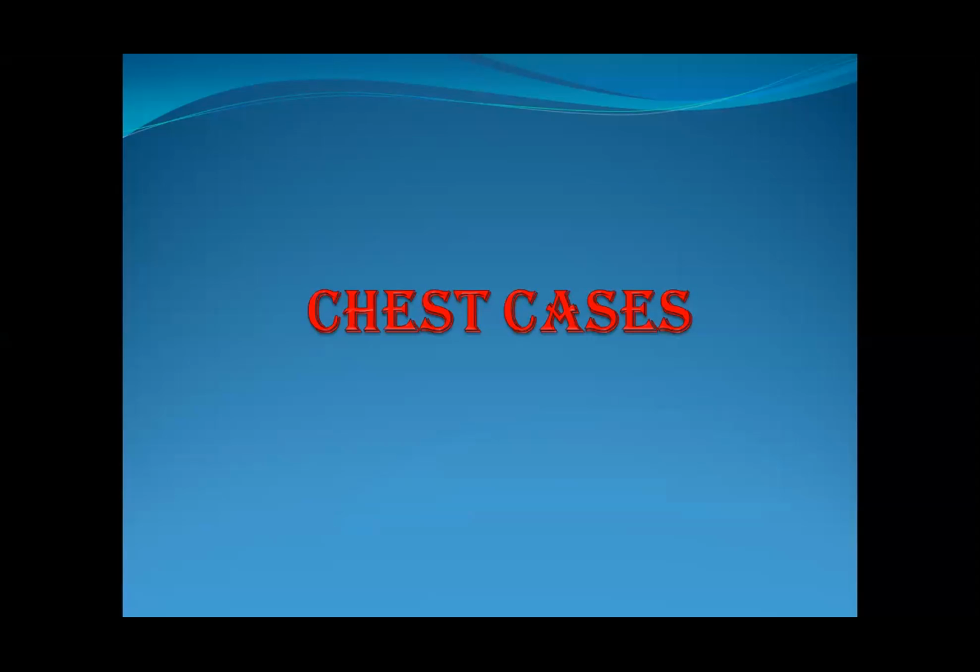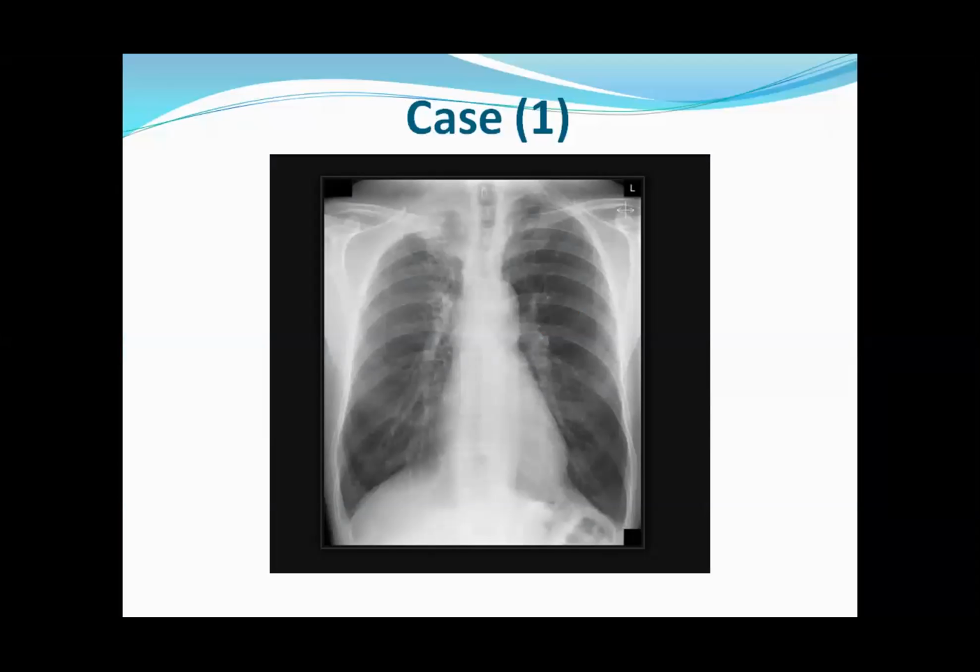Okay, so I think we can start. This is a frontal radiograph of the chest of an adult patient. In this radiograph, the right apex shows a radiopacity involving the right apex. There is some amount of erosion of the adjacent ribs as well as rib crowding. The rest of the lung fields do not show any lesions. The cardiomediastinal margins and the costophrenic angles appear to be normal.